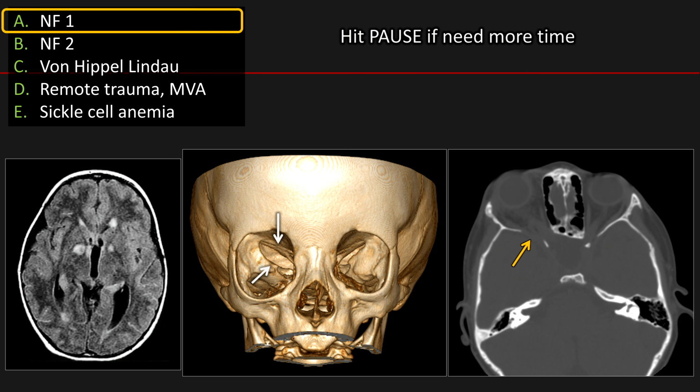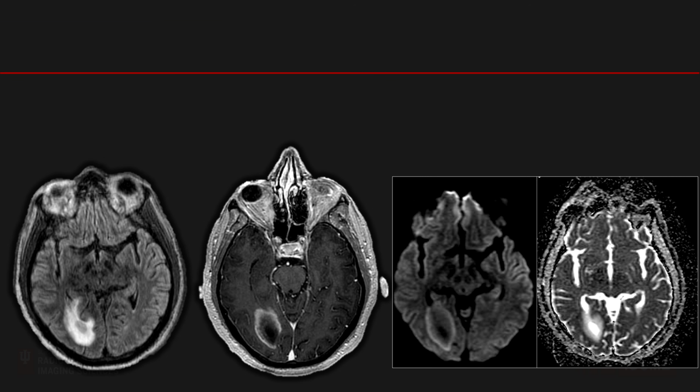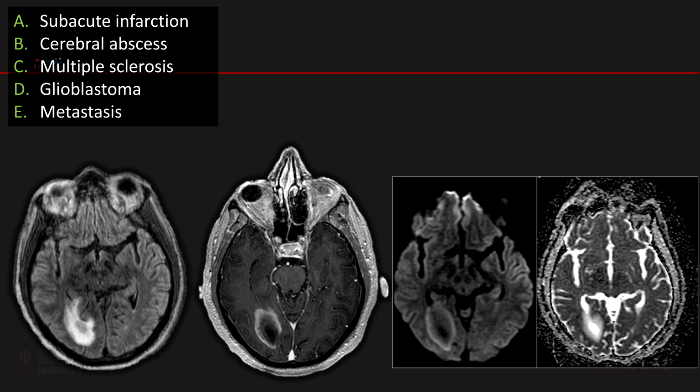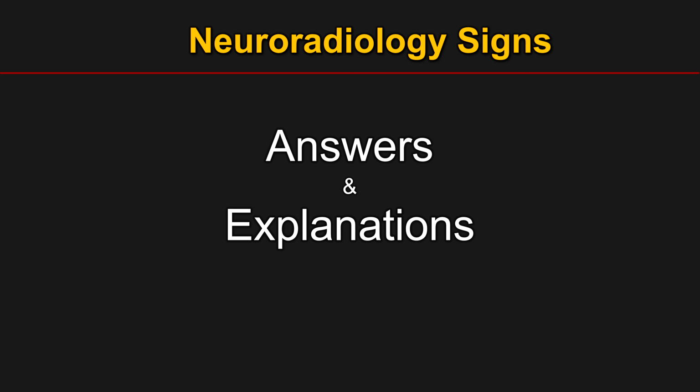This is NF1. Last case. This is multiple sclerosis. So how many did you get right?